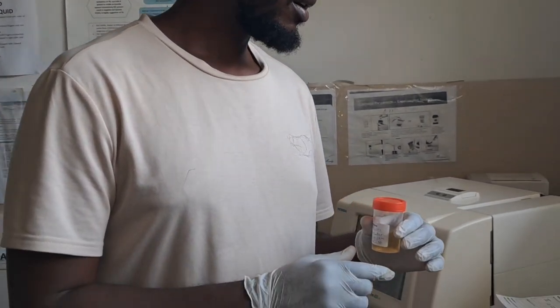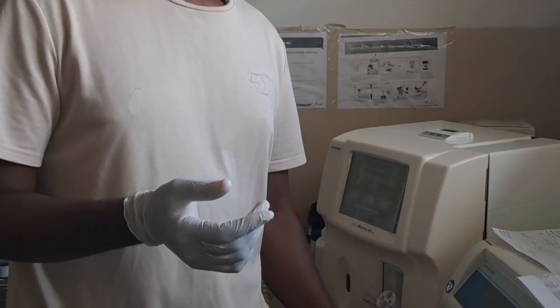Then if you have someone who can do a suprapubic collection, clinicians, or you use a catheter, you can collect samples like that.